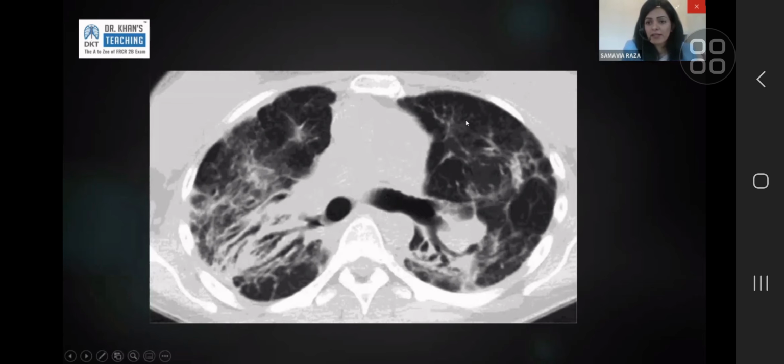Can it be PMF? Yes. Sarcoidosis does not cause PMF. No. So PMF is progressive massive fibrosis. For those of you who don't know, this is commonly seen in occupational lung disease. So the posterior pulling is not specific to PMF. PMF can happen anywhere. So whenever that massive fibrosis or mass-like fibrosis is, it's going to pull towards it. So that PMF can also be in the lower lobe. It can be all over. It's predominantly upper to mid zone, but it's not specific to posterior architectural distortion.